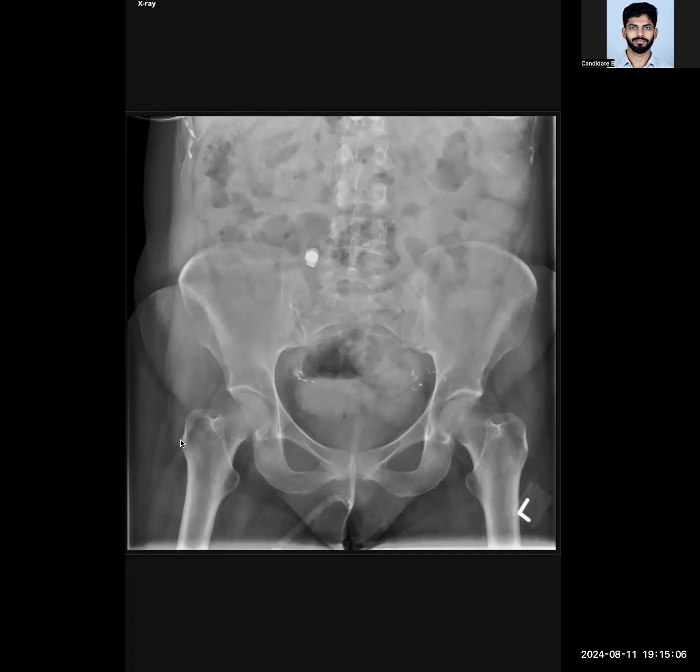Looking through the rest of the areas. Would you describe that structure overlying the right SIJ as a calcification? No, I don't think so. It looks like a foreign body possibly, like a button battery or something, because I can see some lucency surrounding the opacity.